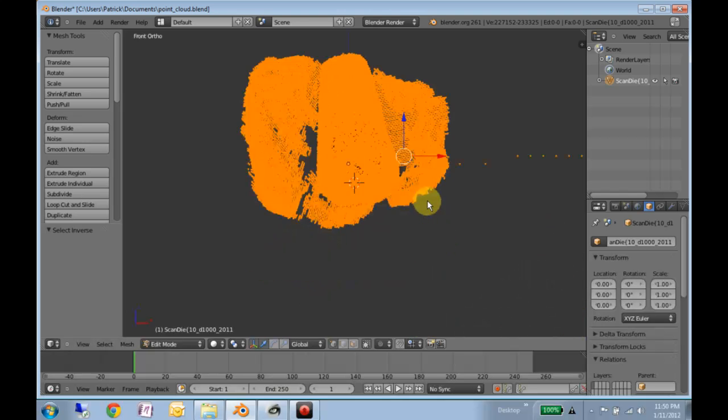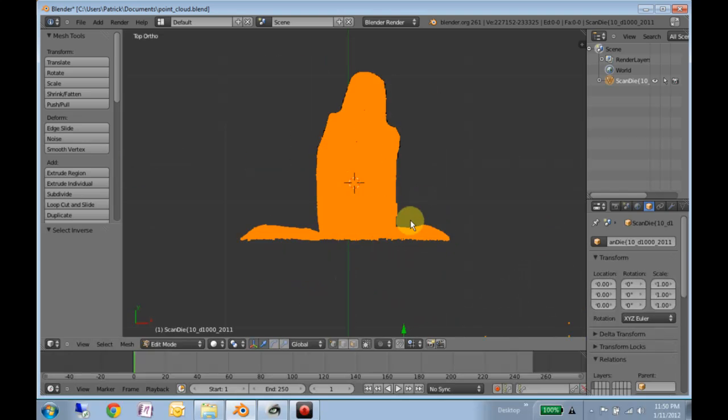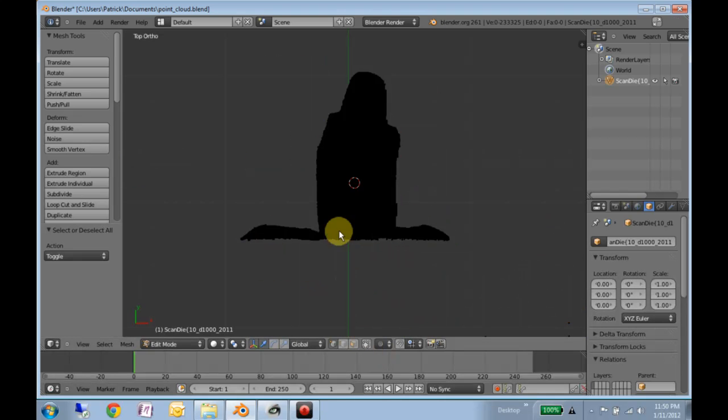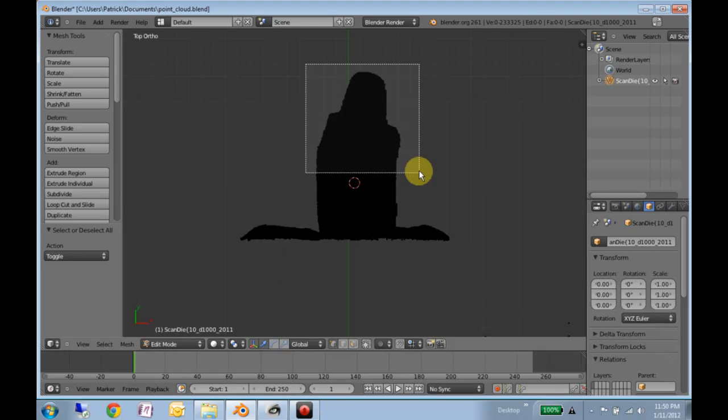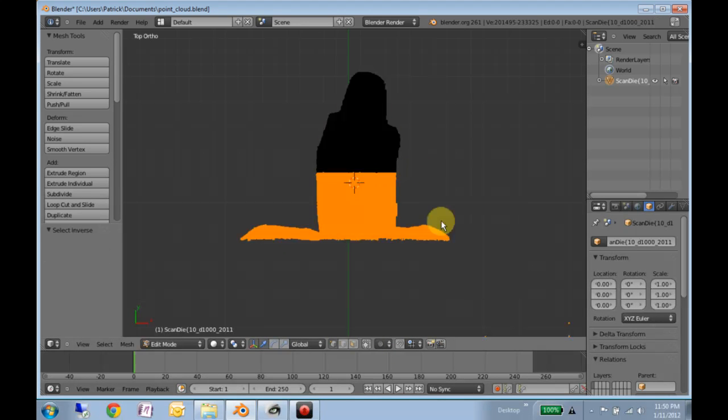Let's see if we can show it. Well, no matter. But make sure this happens here. Okay, delete them.